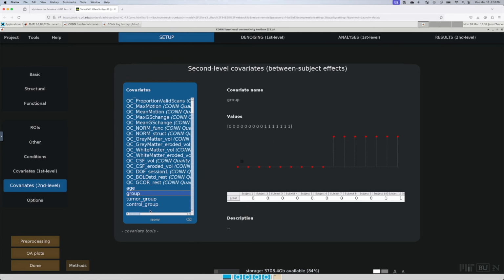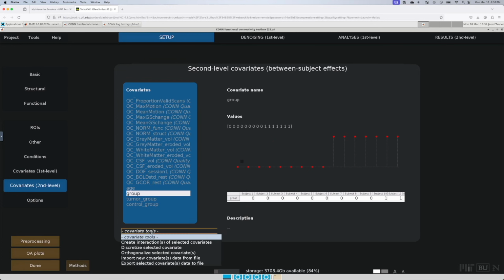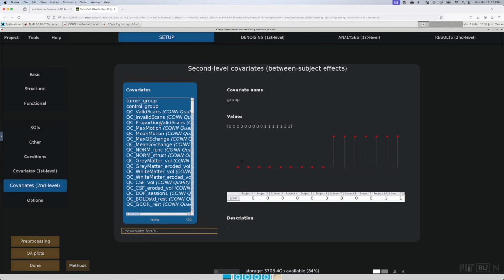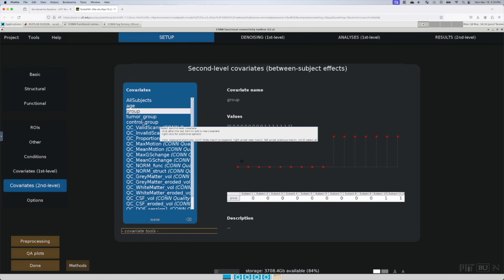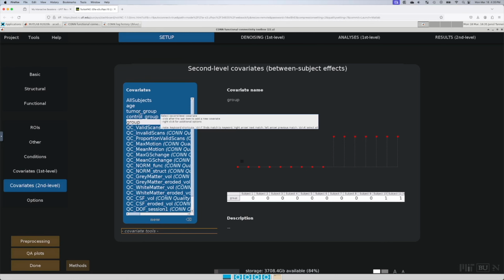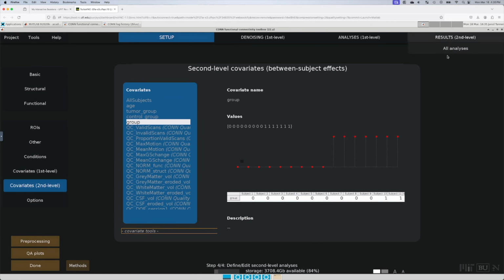So I'm actually going to move group down. Right click. And oops, I want to move selected one down. These other ones, that's fine. I kind of moved them around. That's okay. I'm just going to move group out of the way. Hopefully you don't have that error. If you do, this is one way to get around it.